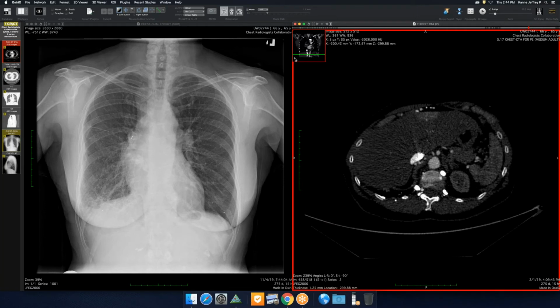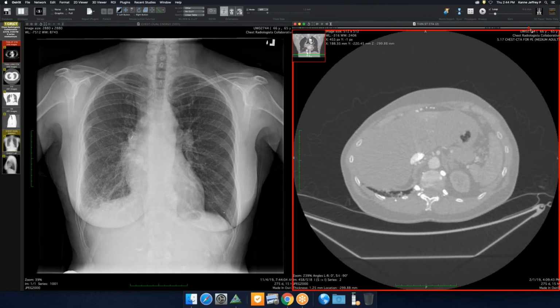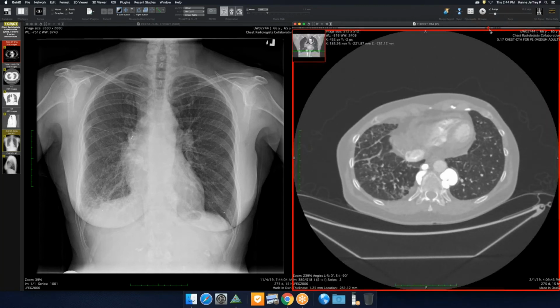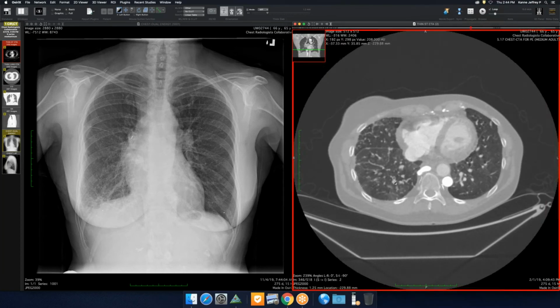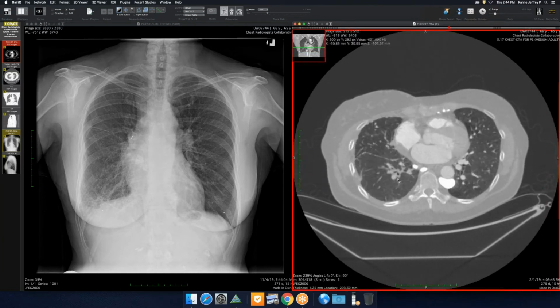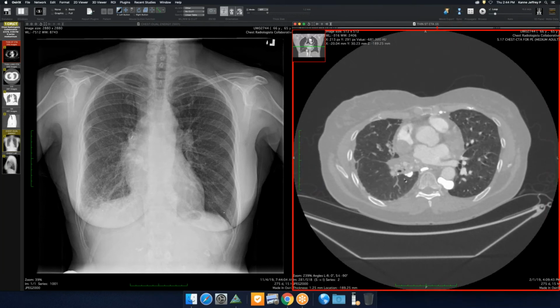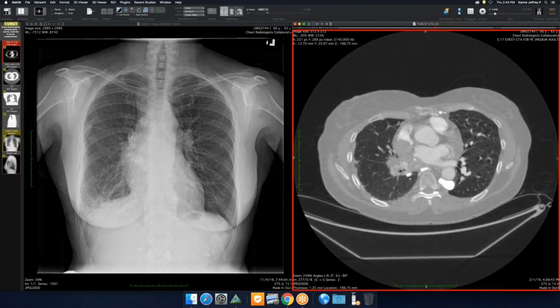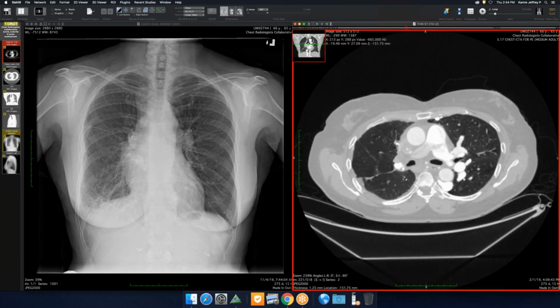If you look at the lung windows, do we even see signs of interstitial edema in the right lung in the form of septal lines or peribronchial fluid cuffs? Yes. You see some septal lines, and then you can see the bronchial wall thickening, which is presumably from fluid in the walls or in the lymphatics. Because if the veins are out, the presumption to me is that the lymphatics are gone. At least the central lymphatics are out because they're even lower pressure. And that's the typical pattern: you lose the lymphatics and veins first, followed by the arteries. And the airways, if they go, are the last to go because they're pretty rigid.